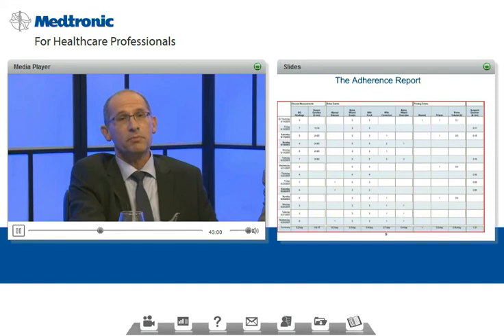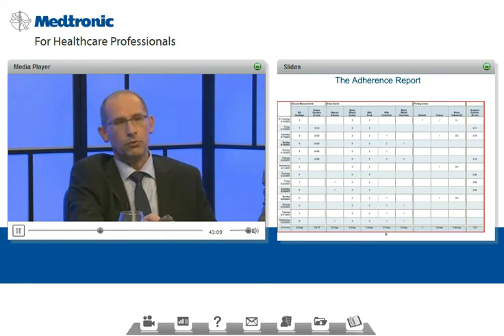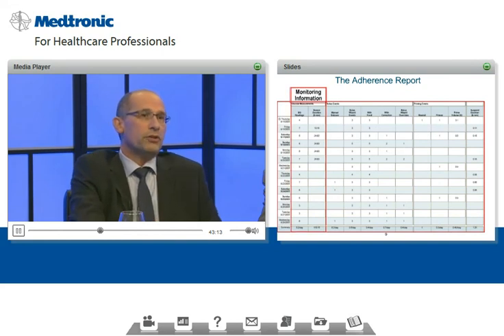The last part is the suspension. A patient who is suspending a lot, the pump is not using it, and it's important to us to have this information in an objective and easy way. And I'll just show you the example of two patients.